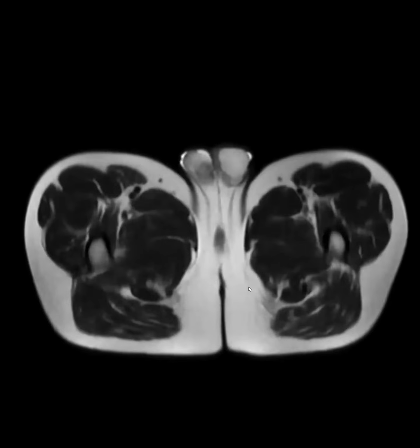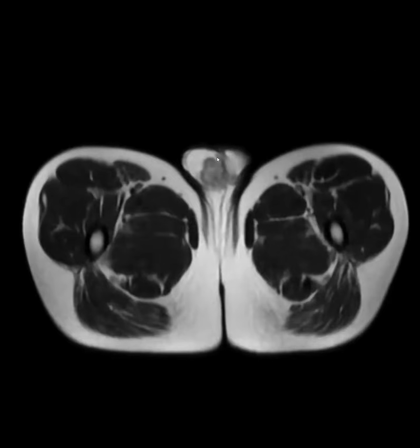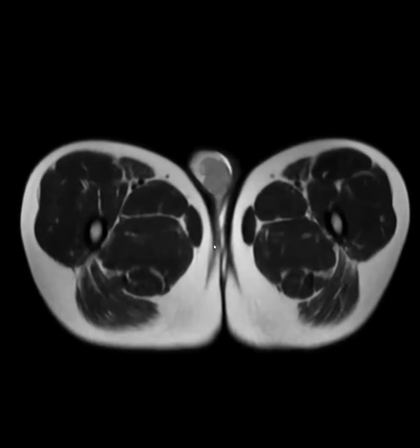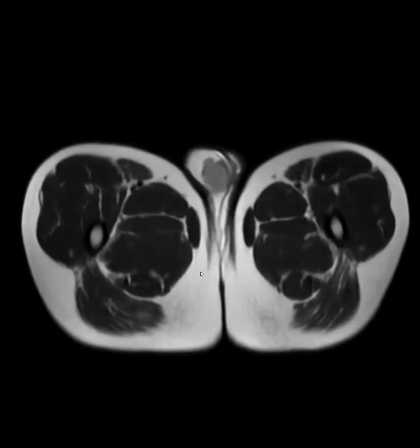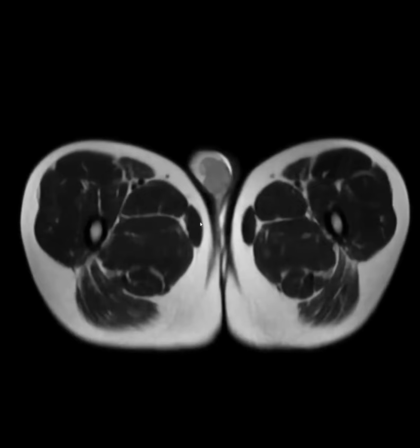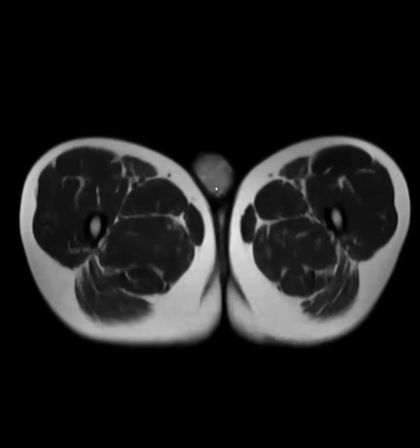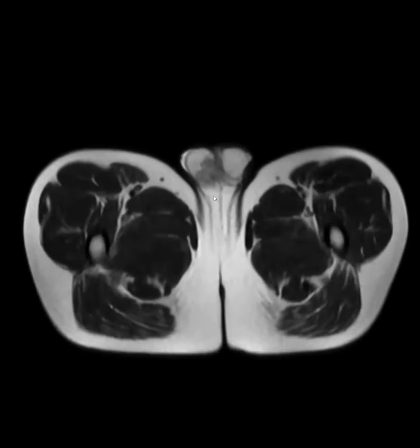The answer was on the scan because we scanned all the way through the scrotum. Oh yeah, look at that. Oh wow. Wait, was that intentionally scanned through the scrotum? We don't always scan through the scrotum, but I was very grateful that we did this time. So it was accidentally scanned, then we happened to see it, or we knew the diagnosis? It's a very good question, but we don't always go through the scrotum. We did not know the diagnosis at all. Oh wow.